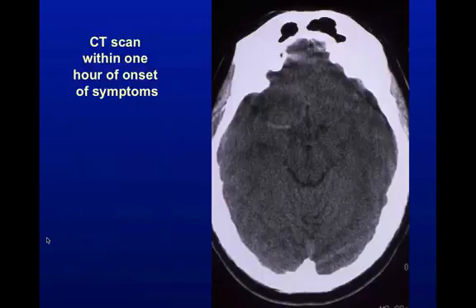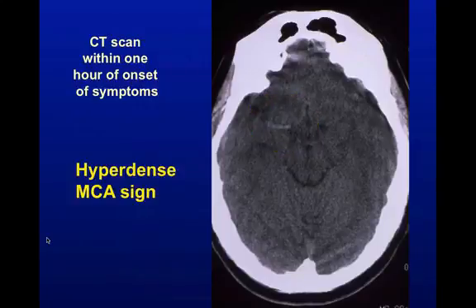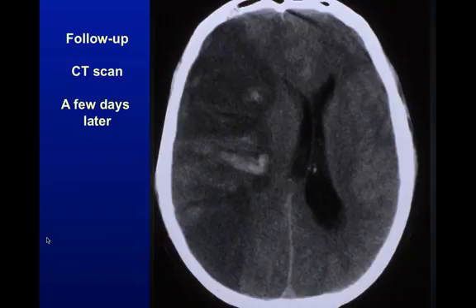Okay? That person is going to lose brain from here to there. That is a third of their brain that's going to get wiped out because that's what it supplies from vascular supply. So this is an ominous sign. This person's going to come in with a high NIH stroke score, about 22, something like that, devastated. And they're going to do very poorly unless treated very aggressively. And TPA is probably not going to handle that by itself. It's too much clot burden. So hyperdense MCA sign.